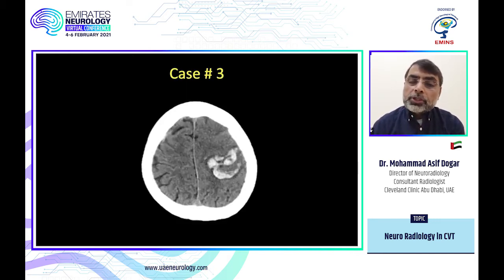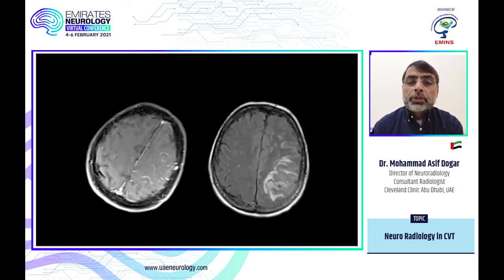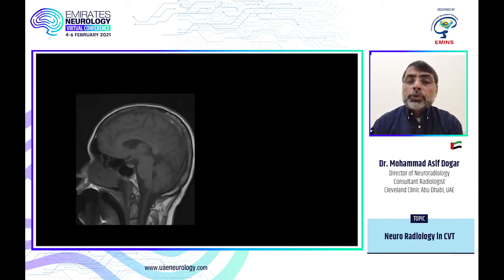Another case on the same theme, there's a hemorrhage. Again, it is interrupted hemorrhage, with normal parenchyma in between the hemorrhages. So this is highly suspicious of venous sinus thrombosis. MRI can be confusing. Actually, this patient has a breast carcinoma and they sent the patient to rule out metastatic disease. You can see edema here, and you can even see some leptomeningeal enhancement or vascular engorgement, which can easily be confused with metastatic disease. On the MRI, the images without contrast are very helpful.